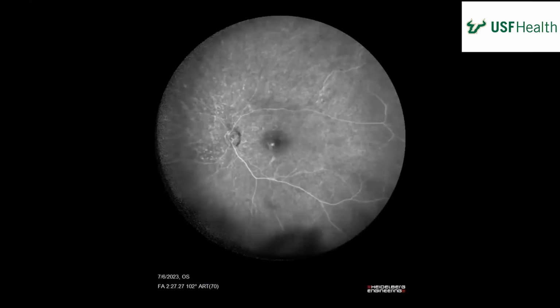And here's just the recirculation phase here. That's an ultra wide. So that image is a super duper extra ultra wide. Mostly again, looking for non-perfusion. Usually when I'm looking in the periphery, which there isn't exactly there. See that temporal vessel is kind of goofy looking. If you get over temporally, it sort of splays out and circles back. When you get in the far periphery, you can see that sort of stuff. And I don't think that's the thing about peripheral imaging. We never could really do it before. I think that's normal. It's just a funny looking peripheral vessel.